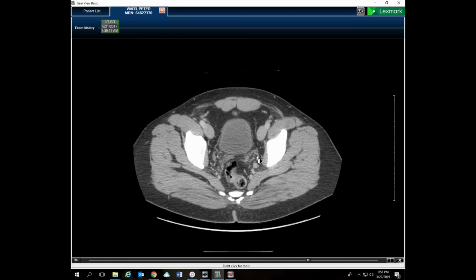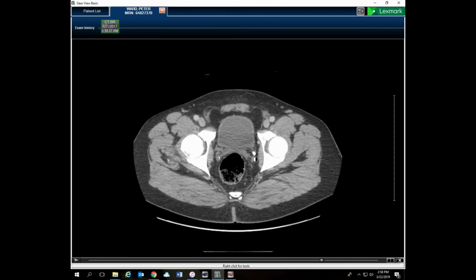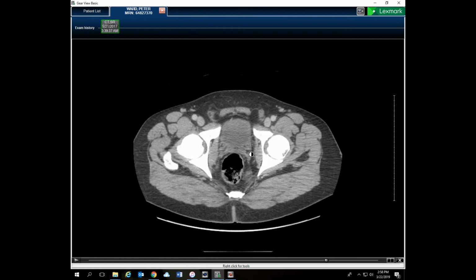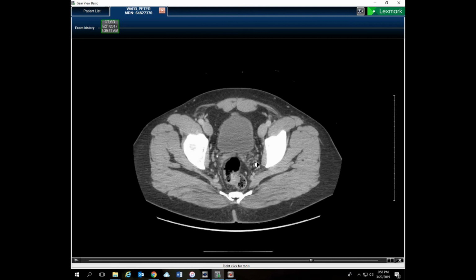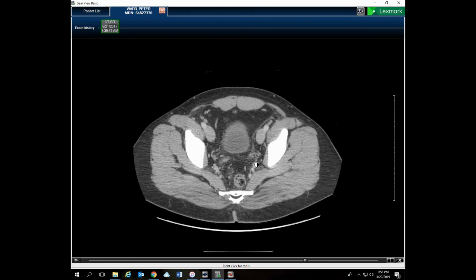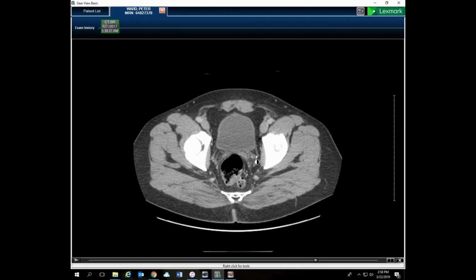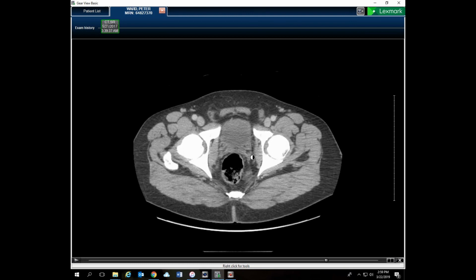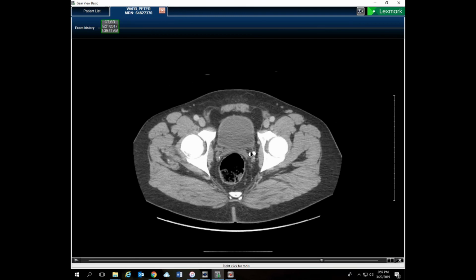Bright dot, followed by another bright dot, followed by a far brighter dot right there. And that bright dot and the others are renal calculi that were lodged in my ureter, and very likely the cause of my abdominal pain, except I wasn't aware of them, nor was I aware that I passed them. So very interesting to have those guys there. Another possibility would have been calcified lymph nodes, but they're right along the course of the ureter and likely to be the cause of the problem.